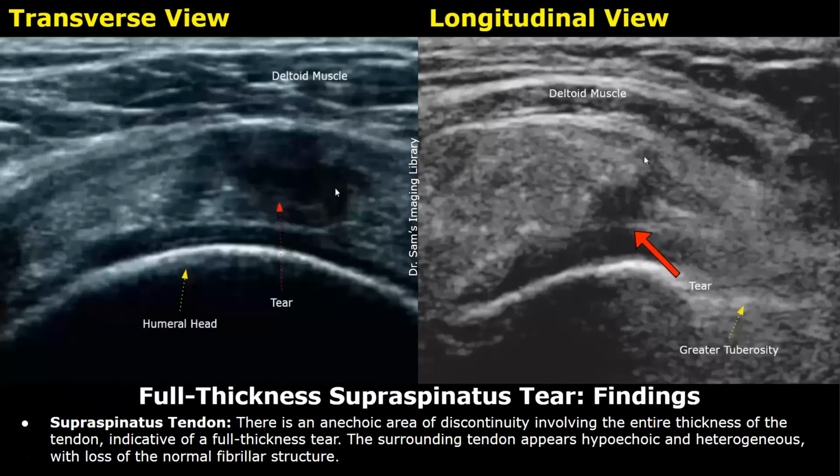Due to repetition, I have removed the normal findings of the shoulder structures. Only the pathological findings are written, so those normal findings will be the same as the findings shown earlier. They are excluded.